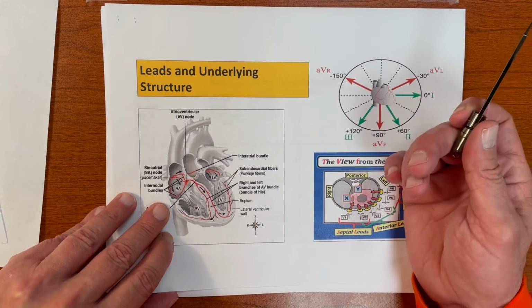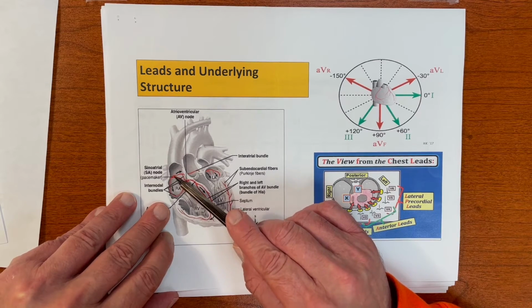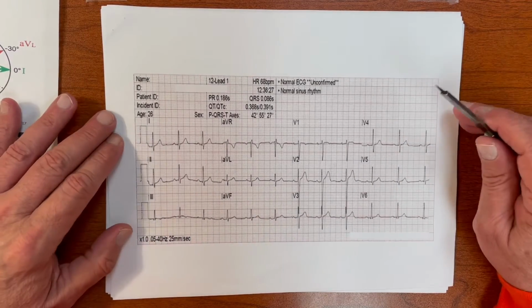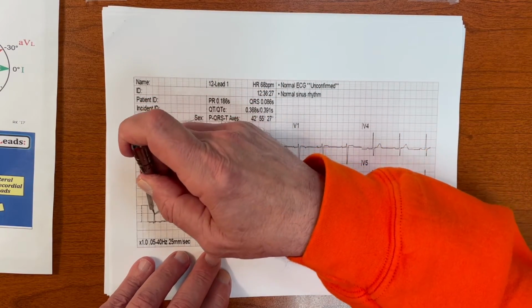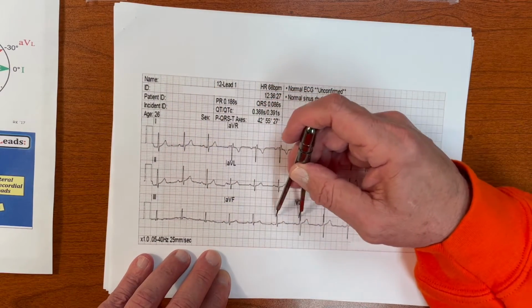The EKG can only tell you so many things. So it has to be identifying what a normal P wave would look like. So normal versus abnormal P wave. So here we go. Let's look at a 12-lead EKG. I'm going to reinforce what we've already done, not to bore you to death, but I'm going to look at what would be the rhythm strip. I set my calipers. I'm regular.